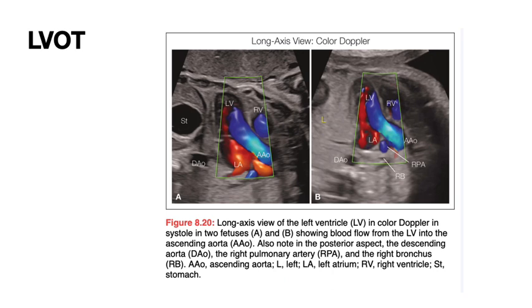One of the ones that they frequently will quiz you on is, look at the picture on the right, and that's the RPA, the right pulmonary artery. We know it just tucks under the transverse aortic arch. So the aortic arch curls up like a candy cane, and when you think of, well, what is that candy cane hooked over? It is the right pulmonary artery.